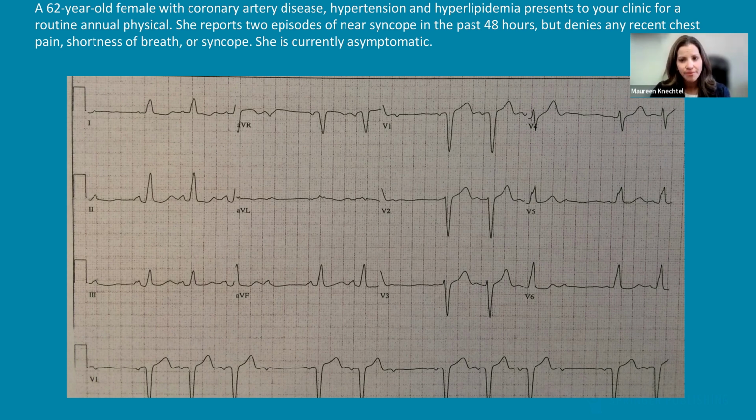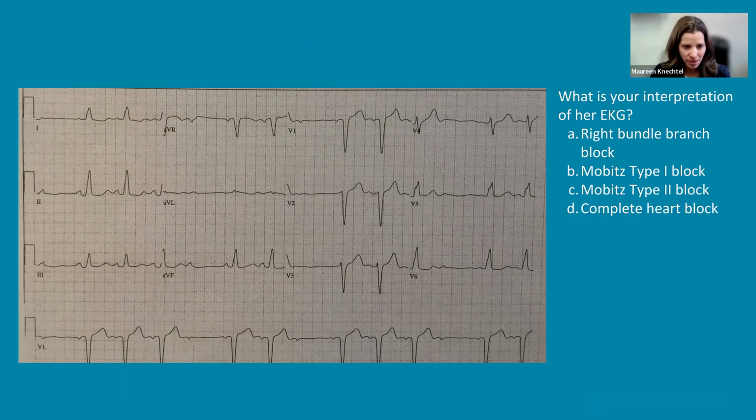And I always say, don't just rely on your eyes. Always get some calipers and try and measure that to be completely sure. So this is a Mobitz Type II, and let's talk about some take-home points with that.